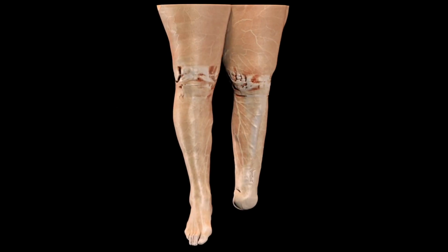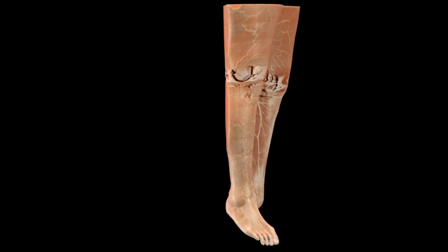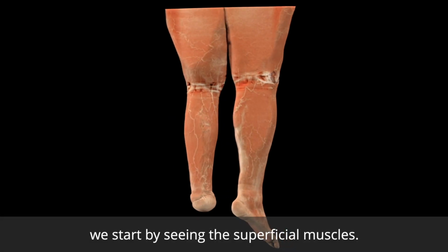Anatomage patient case number 184, knee replacements and amputation. This patient has had both knees replaced and has lost the left foot. Using Anatomage 3D technology to look at the patient scan, we start by seeing the superficial muscles.